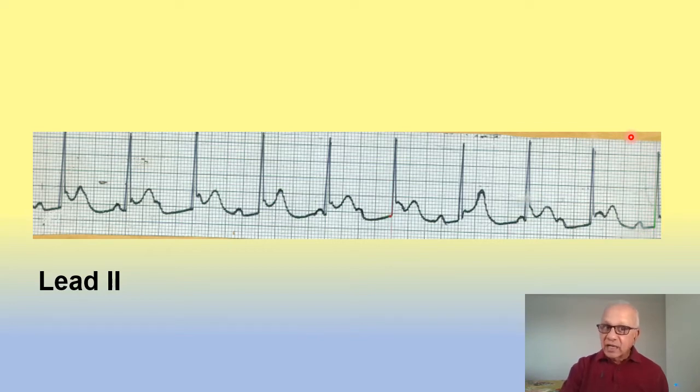So hyperacute myocardial infarction is one diagnosis. Another we said is an early repolarization syndrome, because we told you that the patient is 20 years old. So it could be early repolarization syndrome, which is seen sometimes in normal young adults. But the changes are usually more in the precordial leads, V2, V3, etc. Whereas here this is lead 2. The third condition is pericarditis, acute pericarditis. Acute pericarditis, what is the change? ECG change is a ST elevation with a concavity directed upwards.